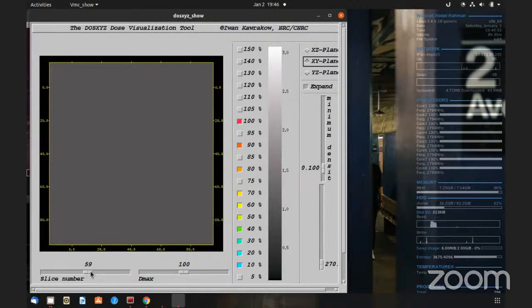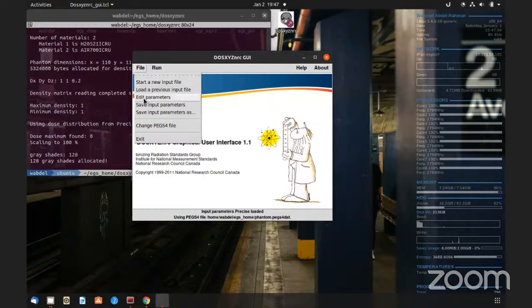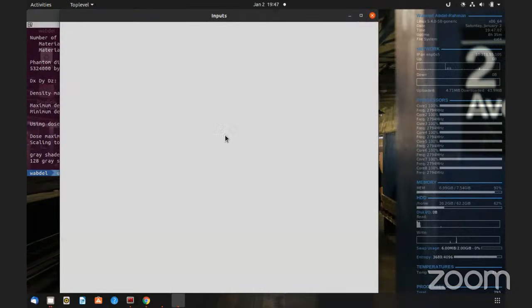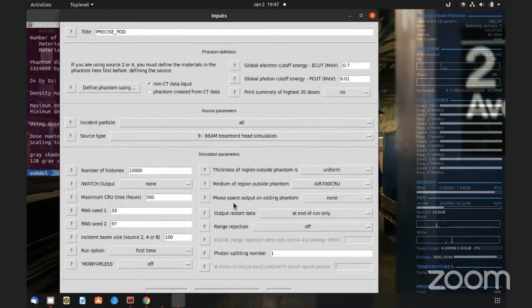So nothing is actually deposited there. What's going on? I really don't know what's going on, but I know I made a file that works. My file works. So I'm trying to get what's going on here at the end of the run.